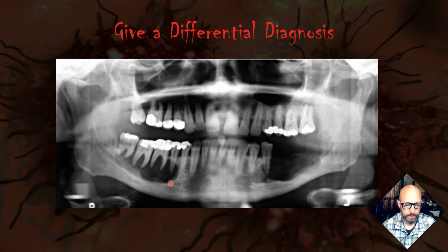Go back to that previous case. I can't do it now, but if you go back to that previous case and compare it, the chronic periodontitis comes from the periodontal attachment, and it doesn't have this underlying scooped out appearance, is what we call it. So that's one of those key radiographic signs, the scooped out appearance. Strong indicator of Langerhans, although it could be a metastasis, but it is an indicator of something much more severe than your typical periodontitis.